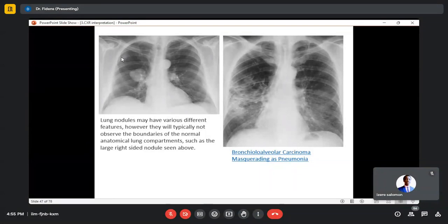Can you see the small nodule here again? Yes. If I see this now, I fear that this may be a malignant process, because I see these two things, this mass and another nodule there peripherally. I fear a malignant process. Costophrenic angles are sharp. The rest of the lungs are clear. The mediastinum is okay. The heart size is normal. So nothing else but these two nodules or masses.